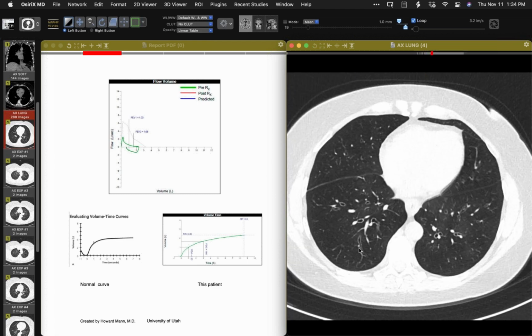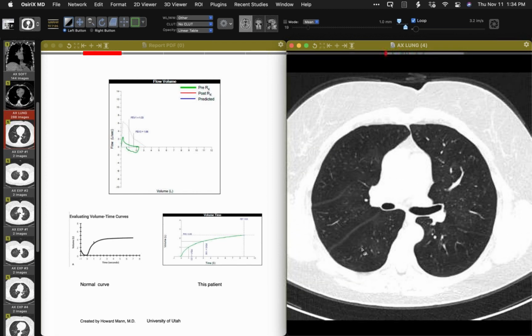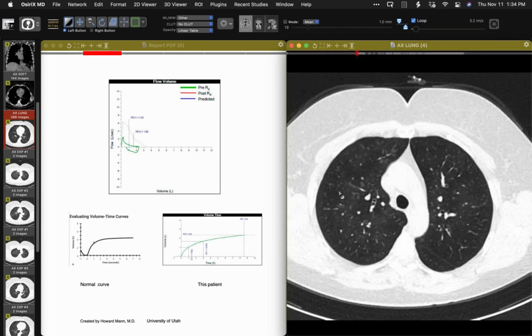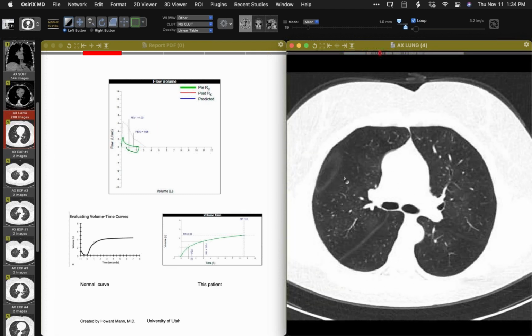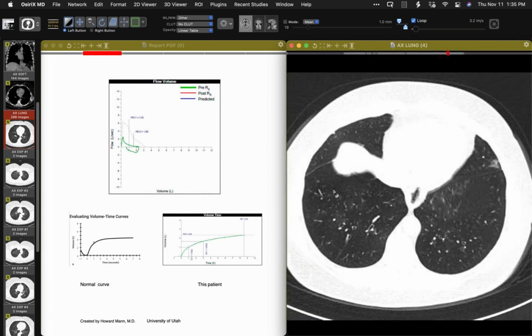Agreed. And Howard, even on the inspiratory, if you narrow the window, you can see there's very little normal lung there. Like you're saying, on an even tighter window than that, you'll be able to tease out a difference. I think part of the problem in perceiving all of this is that it's so bad on both sides. You're not aware of much difference. If somebody doesn't move any air and the lung stays black on both sides, it starts to look normal. But the paucity of vessels is still abnormal, despite the more uniform blackness.